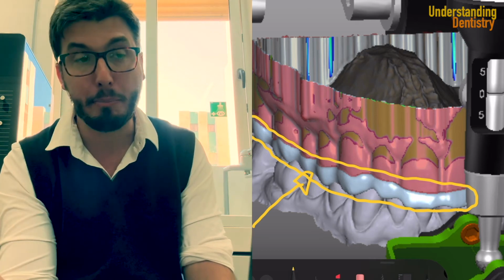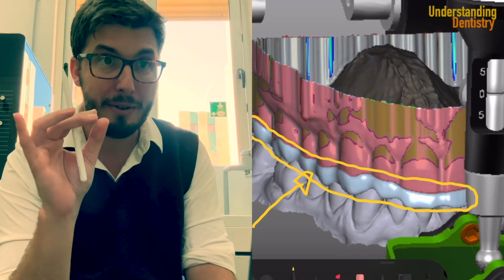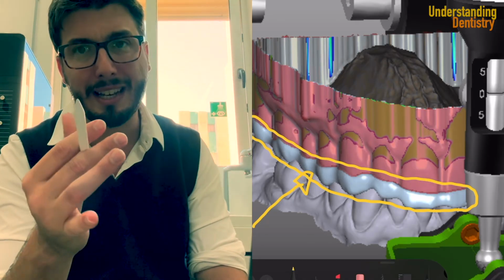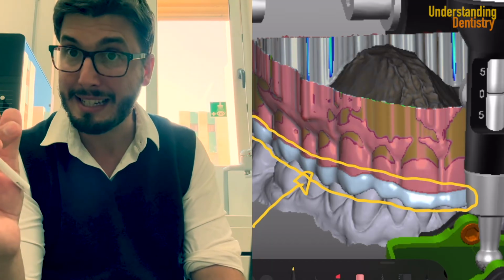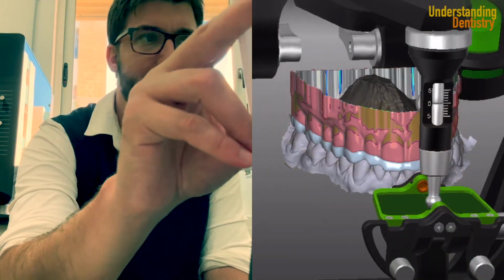That's basically the purpose of this occlusal splint in this case, and that's the one we are trying to do here, using a very small thickness of material, okay? So the design is also a design that we do in the CAD software. Of course, we need to avoid undercuts here, and we want to make sure that this will fit properly, right?